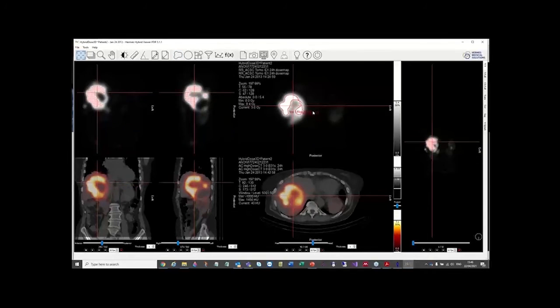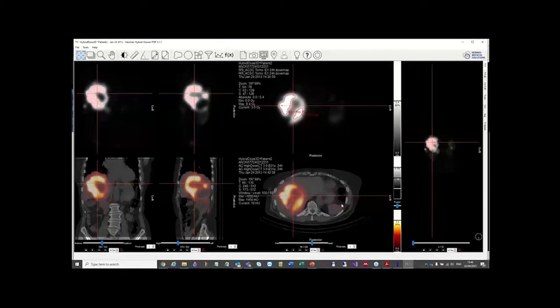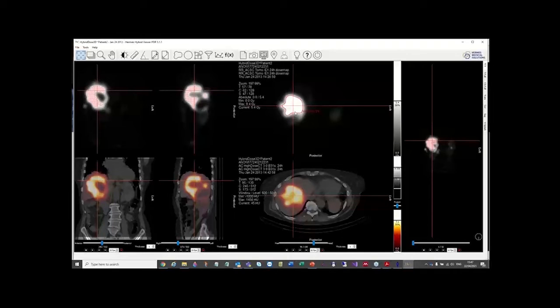So that's the full workflow really for voxel dosimetry. You can spend some time here, as Lara showed, drawing volumes around the spleen or around the liver and transferring them over to here, to get those organ doses, as well as the easier threshold dose for the lesions. And as Johan has been alluding to previously, the facility to process the three-dimensional dose maps will be available in the next version of Affinity as well.